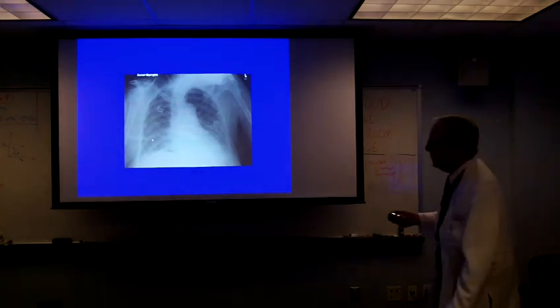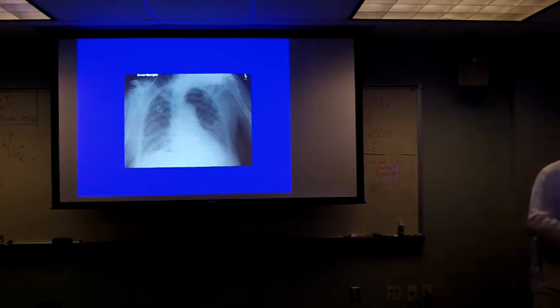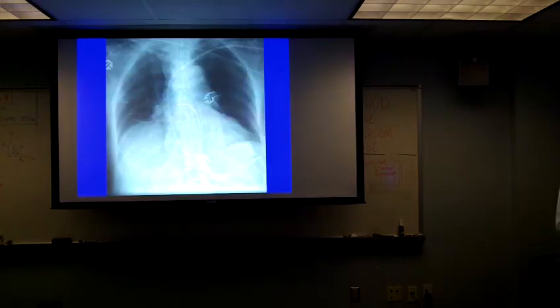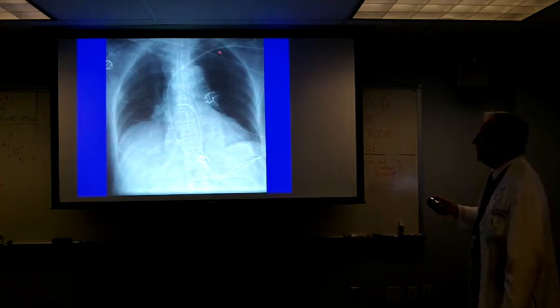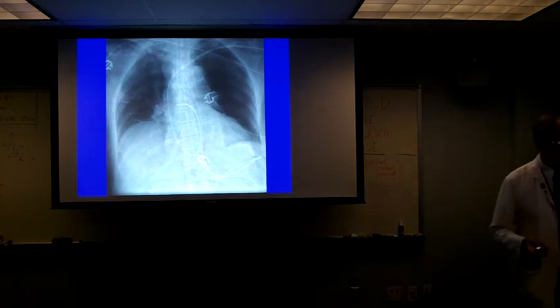Here's just another example. Same thing. Notice also that it's not as lucent as you would expect if that were really a pneumothorax. This particular case, we see probably at least once a year, something like this. See this line right here? House officer saw that, didn't show it to a radiologist, didn't ask any questions.